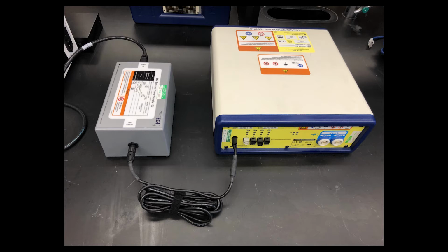One end plugs into the leftmost plug on the amplifier, and the other plugs into the amplifier power supply. To connect to send, you need to plug it in and twist the sheath so that the cable is locked into place and cannot be pulled out.